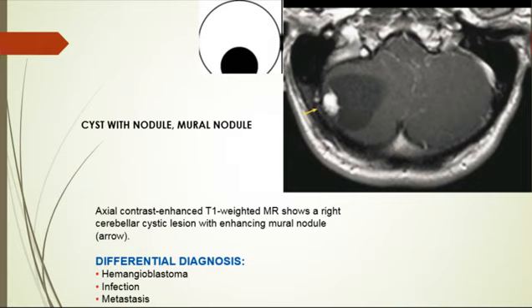Hemangioblastoma is hypervascular with intense contrast enhancement, with some flow voids on MR. Infection can also yield solid cystic lesions, but they are usually multiple and supratentorial in location. Toxoplasmosis and neurocysticercosis lesions tend to have more well-defined peripherally enhancing cysts surrounding the parasitic organism, what's called eccentric or concentric target, and cyst with dot sign. Metastasis rarely produces a cyst with nodule appearance; in the setting of internal necrosis, it tends to be more heterogeneous. Necrosis will be heterogeneous.